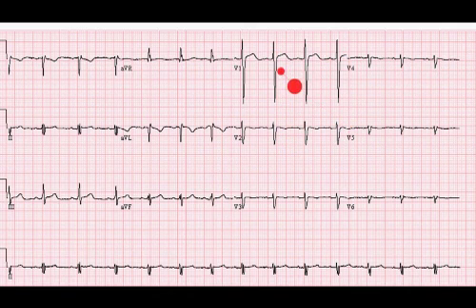In other words, you have an RS structure which gets smaller and smaller the further away you get, because you're going further and further away from the heart. So this is situs inversus. The heart is on the wrong side. Good.